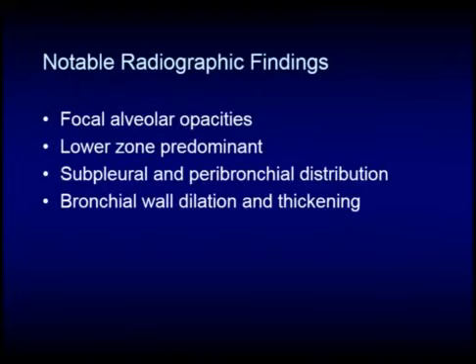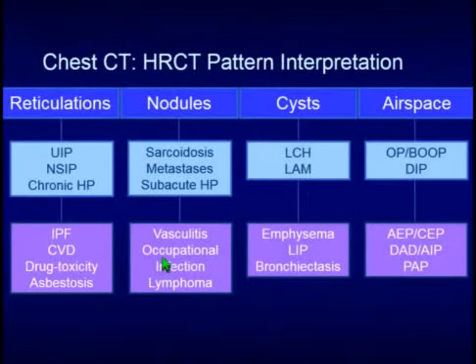There were also some areas where you could vaguely say there was maybe a reverse halo sign or atoll sign, which is only found in about 20% or so of patients with organizing pneumonia. But clearly, this is an airspace disease, and as Rob will talk about, clinical history is really important when you're dealing with airspace disease because the differential is often very broad.